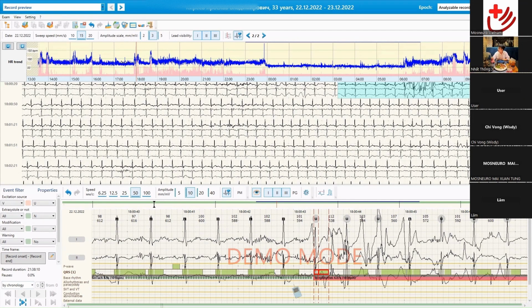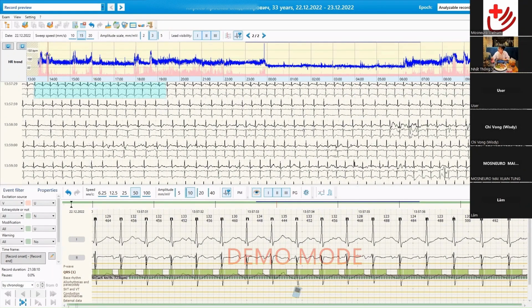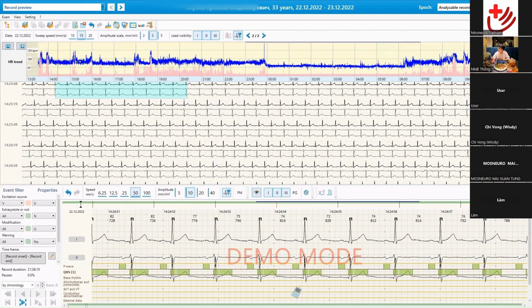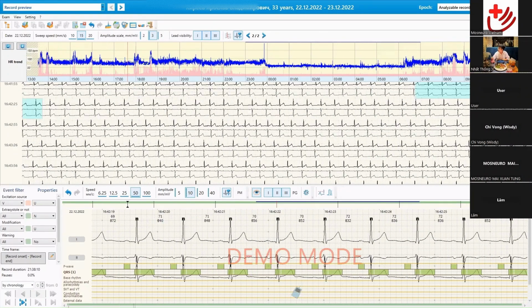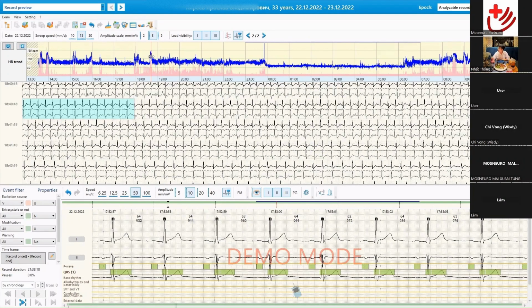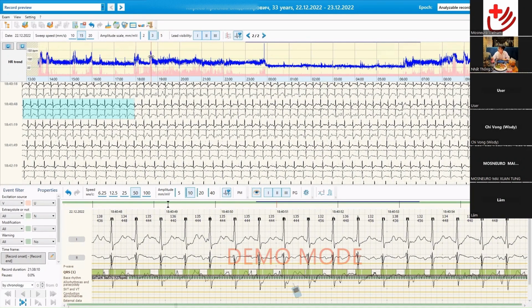Usually by naked eye, you can see how heart rate changes. You can see some spikes, and you can just click the mouse on this trend to see what's happening in this particular part of the recording, how the ECG changes, or if there are some events. That's a very simple thing, and even with a simple thing, you can see something interesting.